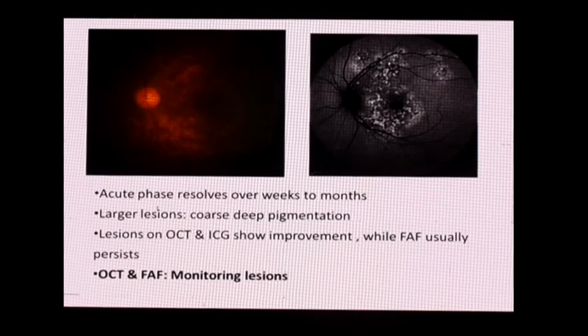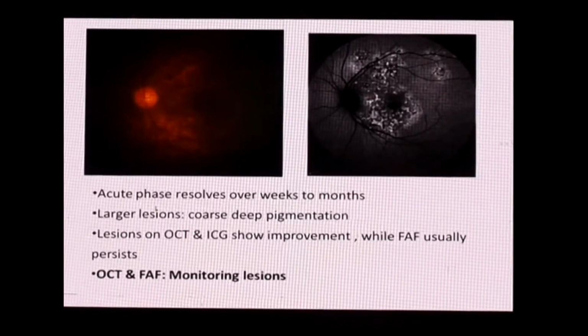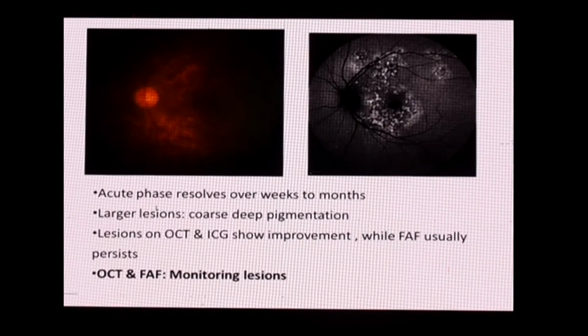So again, the acute phases resolve over weeks to months, and the larger lesions leave deeper pigmentation. Now we use the OCT and FFA and fundus autofluorescence to monitor these lesions. These autofluorescence lesions tend to persist and they don't disappear.